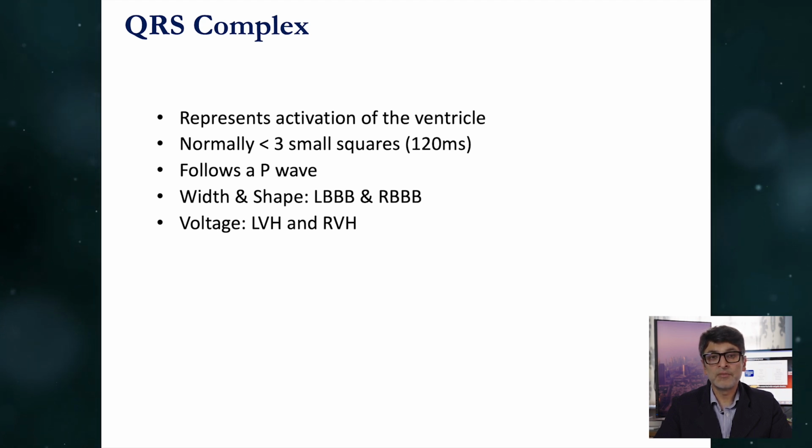Is the QRS complex narrow? Is it broad? Is it tall? Is it short? Because all of that may represent changes that have clinical manifestations that require either further treatment or certainly further investigation. So the QRS complex represents activation of the ventricle.